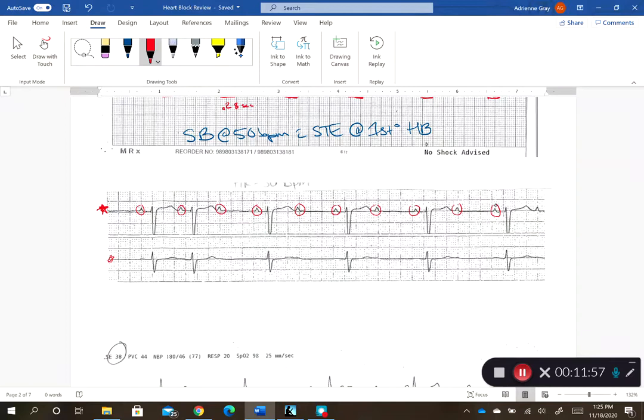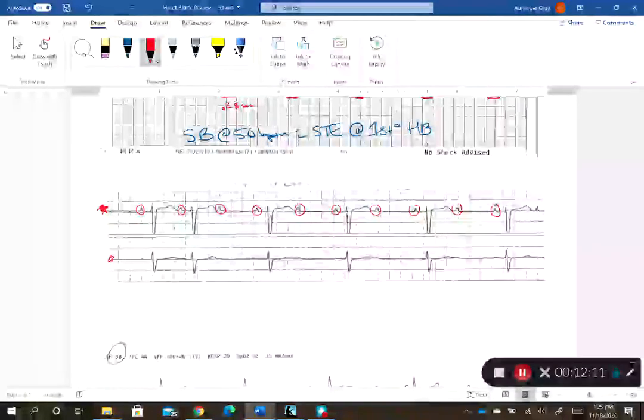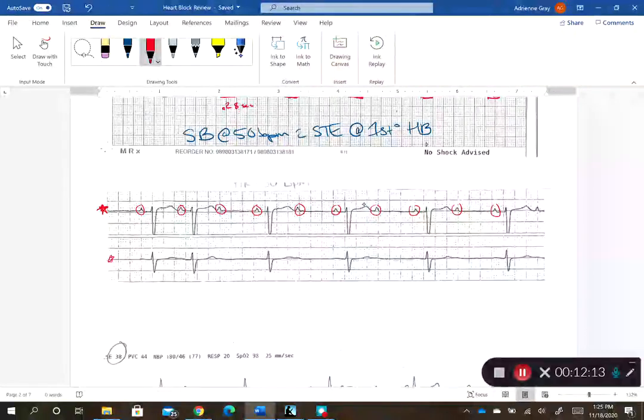So let's just start at the beginning when we're trying to figure out a heart block. I'm looking at this and I'm kind of deciding right away, well, I think it's a heart block because it looks like I have more P's than QRS's. So that kind of signals a heart block. So let's start all the way with first degree. Do I have a long PR interval? Well, my PR interval is probably normal, high side or normal, 0.2 seconds, but it's not long. And I have more P's than QRS's, so it can't be a first degree.